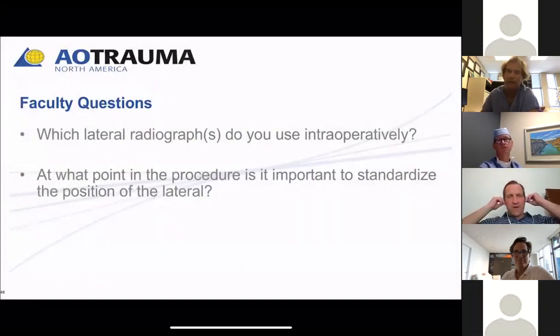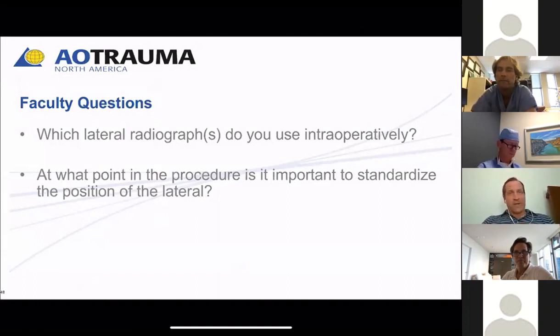It's interesting, right? Yeah, for sure. But to close the fracture line, either flexion or internal rotation, but what's the deformity? You know what I mean? It shouldn't be that both of those can solve a single problem. It's either one: either it needs rotation or sagittal plane correction. Yeah, it's just hard to know which one it is, right? Right.